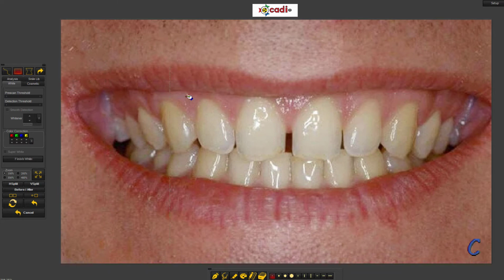What we want to do is outline the teeth as tightly as possible, but still box in the most lateral part of the mouth and the top part of the centrals. Left mouse click, hold, and drag the box open around the teeth as tight as possible. Once you let go of the left mouse and right click, it will activate this area.